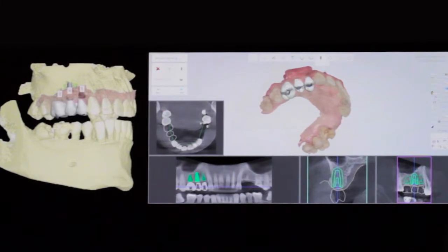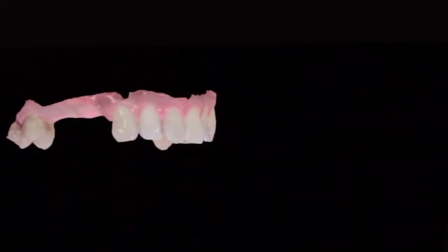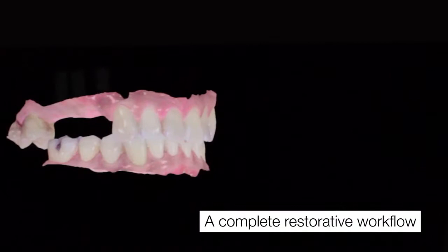A big advantage with the 3Shape Implant Studio workflow for us is the ability for us to take this information, create a surgical guide, as well as take that information and bring it back into the dental design software before we actually do the surgery.